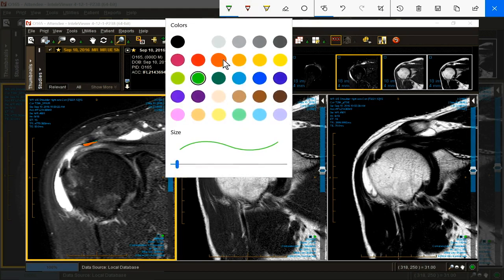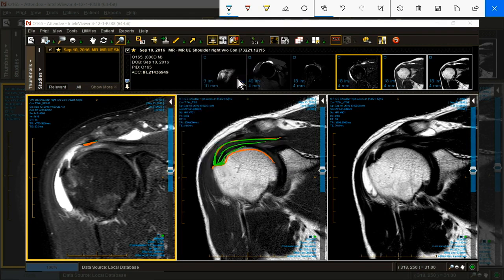If I tear this locus right here, oh, that's a bad color. Let's go black. If I tear right here, you can't see it. The surgeon can't get to it this way, surgeon can't get to it that way, it's concealed. It's a concealed interstitial delamination of the footprint.